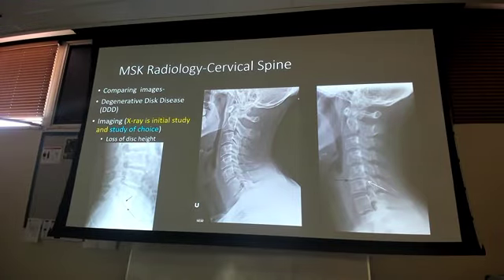Okay. So, a couple of ways we can notice some of these things, right? Again, just like in our knees and with our other arthritises, we have loss of joint space, right? We get that inflammation, we get those osteophytes, we get that loss of joint space. Which part of the spine did we say had the largest space in between the vertebrae? The lumbar, right? What is going on between L5 and S1 right here?